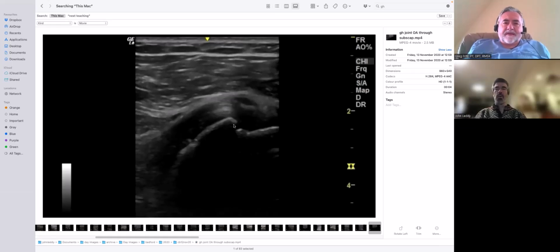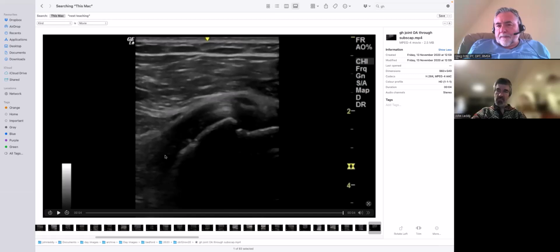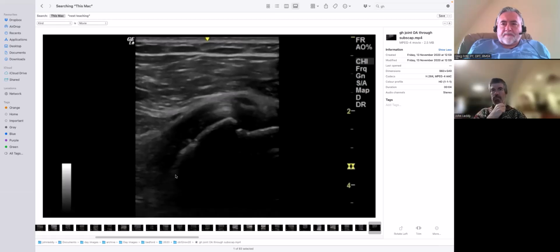And when I thought it was OA, it didn't show up on the X-ray, and so I would not call it. I would say, it doesn't show us. Now I am much more aggressive in the sense that if I don't see a curve that resembles a round head, then I'm very much switched on. I will flag it, particularly if you see this sort of lipping on the edge under there, that's anything that's forcing subscapularis to go around a bit of a corner to get to the target, and that's abnormal.